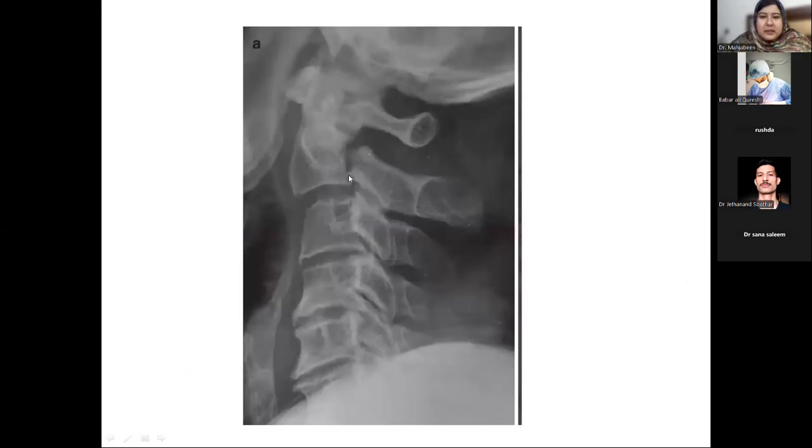Is it clear now? See, this is the fracture of pars interarticularis of C2, and see how it's not that severe, but still a few of the lines that were discussed by Dr. Babar. This line is the anterior vertebral line. Then this line, मेरी खुद की line टेढ़ी हो रही है, but this is the posterior vertebral line, ठीक है?